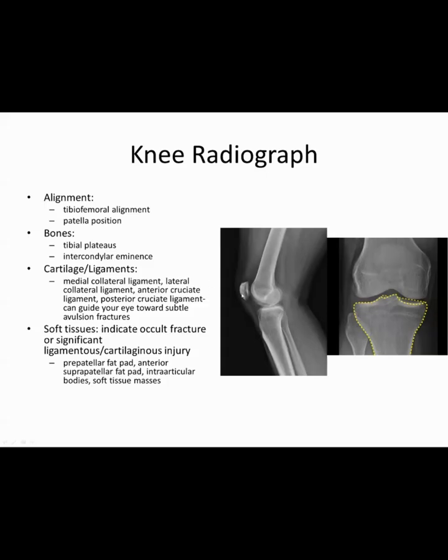Next, you want to assess the position of the patella. Whether a patella is sitting too high or too low has different clinical implications that we'll go through later. And there are actually measurements that you can take to see how high or low the patella is sitting. And we'll discuss that once again over the next couple of slides.